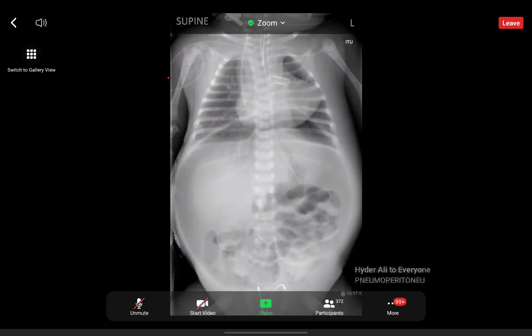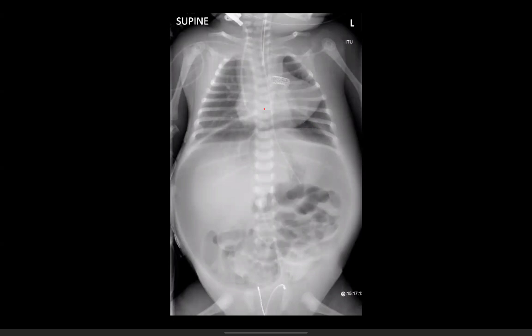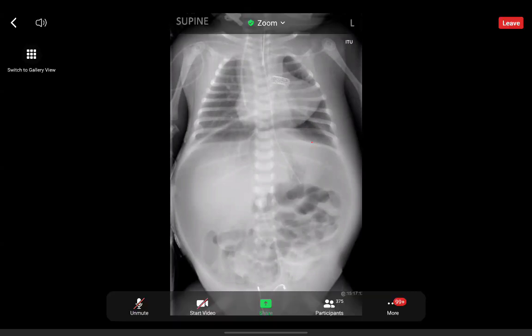So yes, this is gross pneumoperitoneum with a football sign. Here we have a huge rounded lucency over the whole abdomen. We've got Rigler's sign, where we can see lucency on both sides of the bowel wall. We have the falciform ligament here again, and a large domed area of lucency beneath the liver, or a cupola sign, which I'm sure you've heard Dr. Curtis talk about before, because it looks like the dome of an Italian church. Or continuous diaphragm sign, yeah, absolutely.